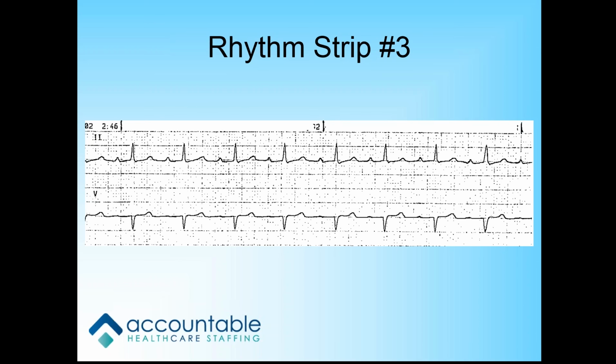So if you decide to transcutaneous pace your patient, what are you going to do to be really nice to me, because I'm jerking every time I get a pace? You're going to sedate me, right? You don't want me to remember you. Yeah. Okay. See, there's your long PR intervals.